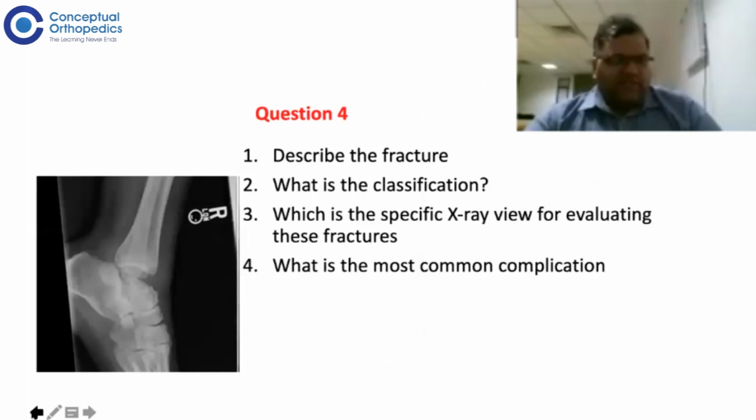Next session is once again a radiograph session. We have been given a radiograph and asked to describe the fracture, the classification of it, and which is the specific X-ray view for evaluating these injuries, and what is the most common complication.